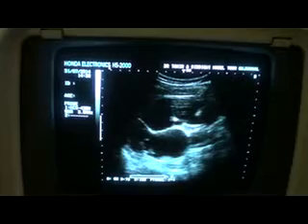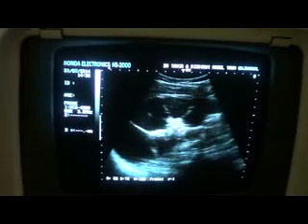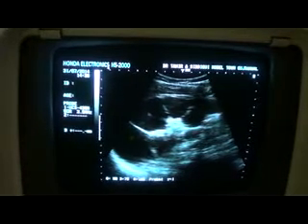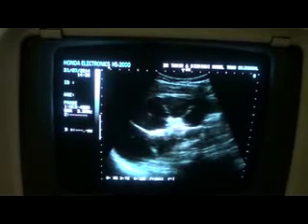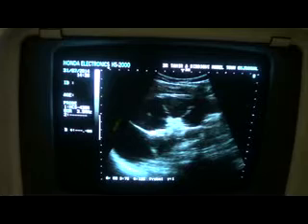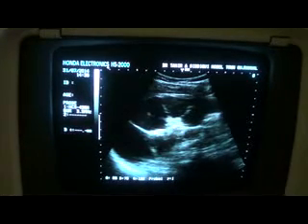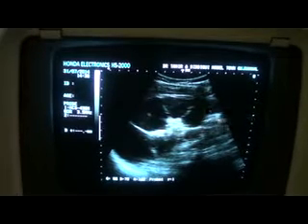Well, now if this is a polycystic kidney, then these cystic appearing areas, and please I repeat that I'm not saying cyst, but rather I am saying cystic appearing areas, will be of variable sizes, and the outer surface of the kidney will not be so regular. Humps and bumps will be seen, and the central sinus echo complex will not be seen.